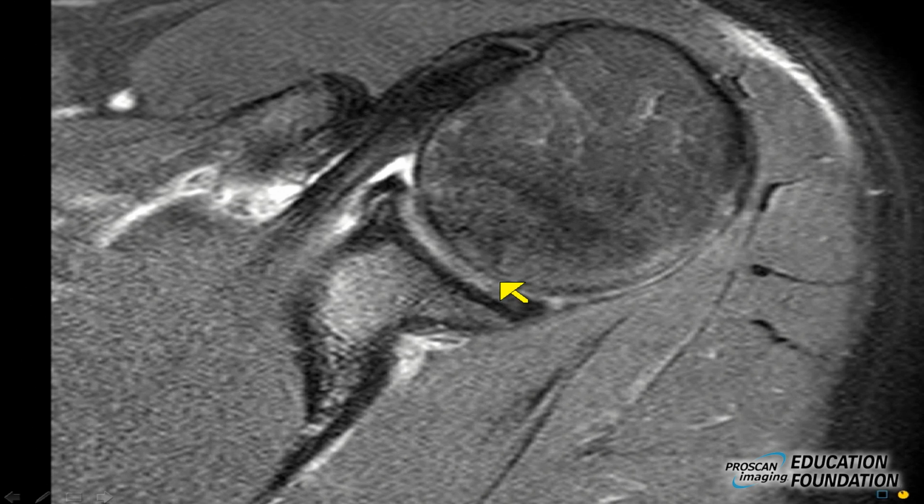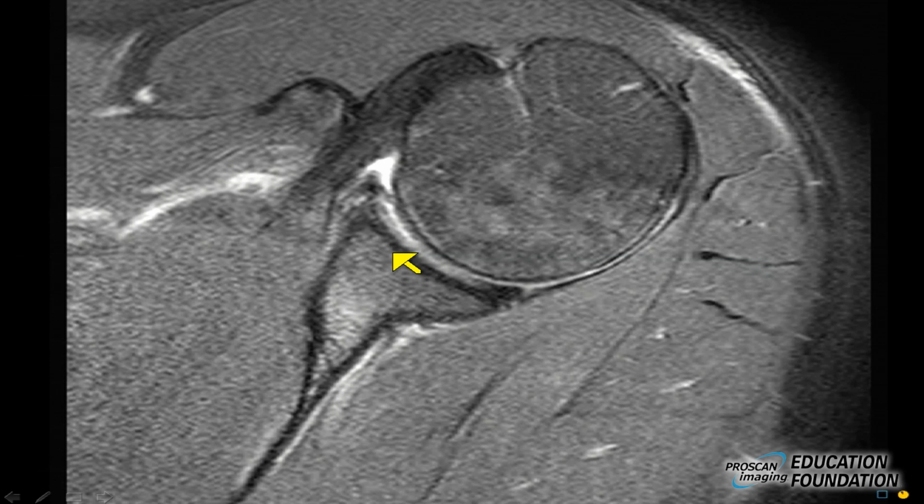And do we see it? Absolutely not. Our space persists. There's a space between the labro-ligamentous complex and the glenoid. Well, let's take another slice down. The space still persists, but it's awfully ragged looking as well. It looks nothing like the smoother relationship of the posterior labrum. It's not as black as the posterior labrum. Two clear abnormalities that violate our golden rules.